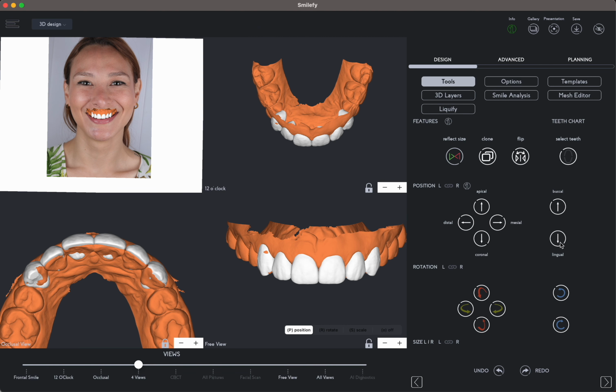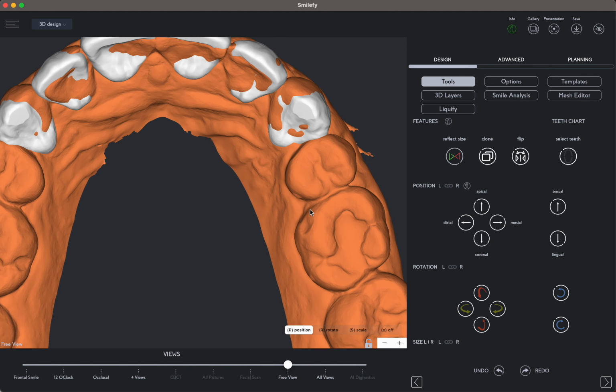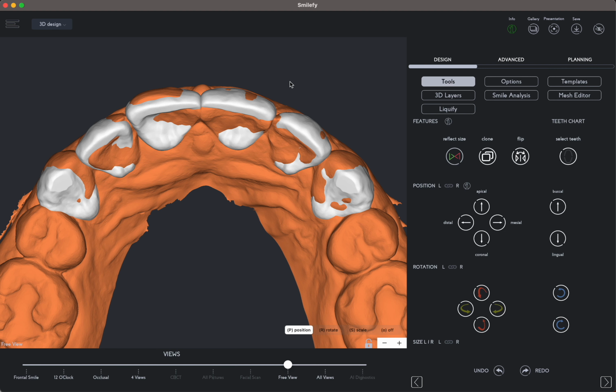Now we design, adjusting the position and ideal pre-op design. The definition of the pre-op design is, the teeth are in an ideal position, and in the project we visualize the areas that need to be reduced from the patient's teeth.